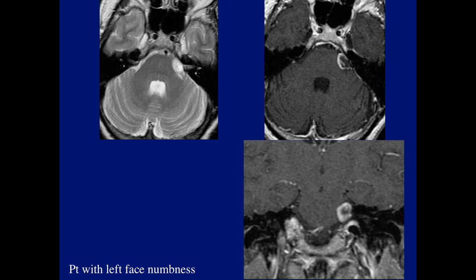Patient presents with left face numbness. Any diagnoses? Very good. Eric mentioned that possibility. I'm waiting for some other answers, but I guess we'll go. Eric mentions the cystic schwannoma.